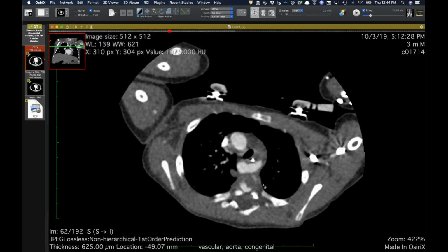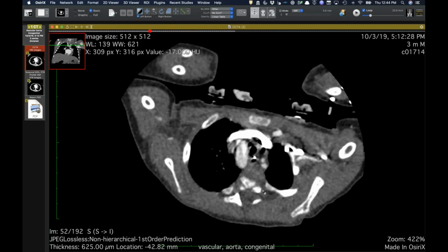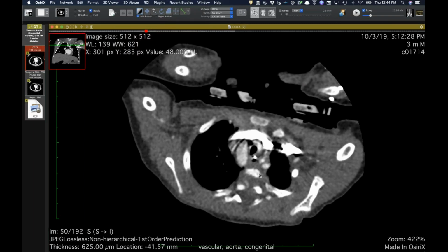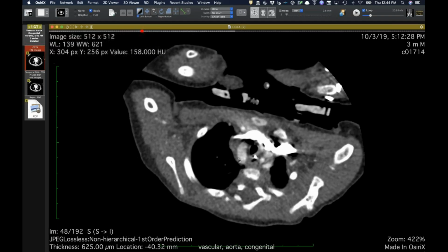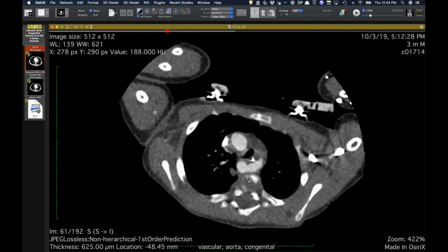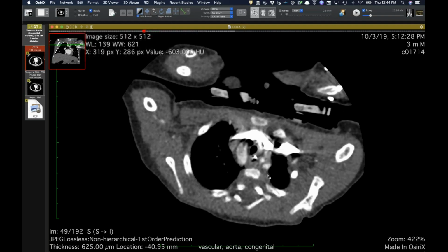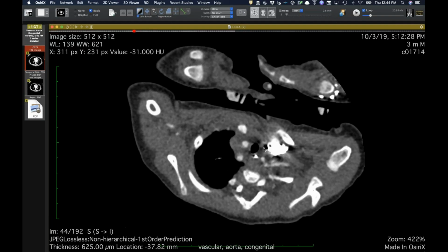Yeah. There in the sternum, and the fact that there's this anterior moiety that's crossing the mediastinum to give rise to this thing, I think is right here? Yeah, a little bit lower. It's very horizontally oriented. Sorry, say that, Howard? There's a horizontally oriented vessel right there. Yeah, the anterior arch, the left arch.